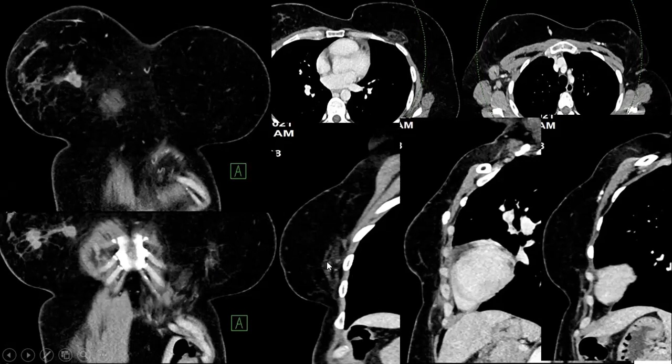This is a flap. What you have seen on mammography is a muscle flap, and the CT is helping us to show that the muscle flap is not latissimus dorsi, but the muscle flap is the rectus abdominis muscle. Have you seen it here on the axial view and here on the sagittal view? Okay, and here on the coronal view, it is demonstrated, and this is the area of dystrophic calcifications.